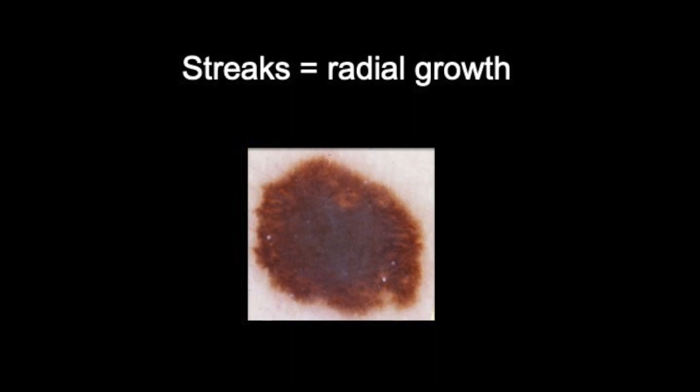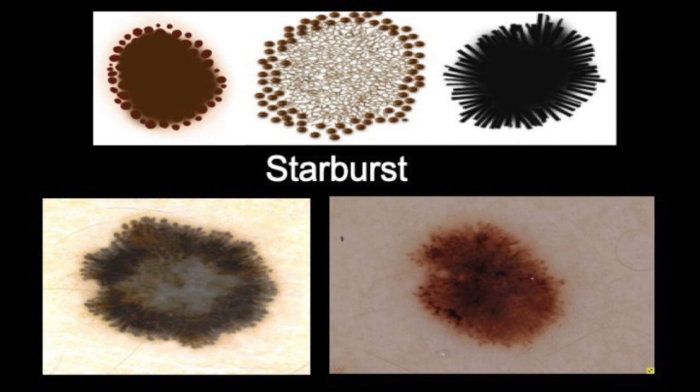The fascicles that are going into the dermis, the banana-shaped fascicles, right? That deeper pigmentation that gives you the bluish hue. That's your classic end of the life of a Spitz nevus of the Reed's type. And then the only other thing this will do, maybe, is involute over time, right? But after senescence, it's not going to evolve again. If it does, it becomes concerning. Okay, so that's your Starburst.